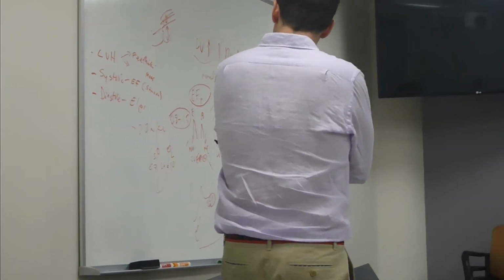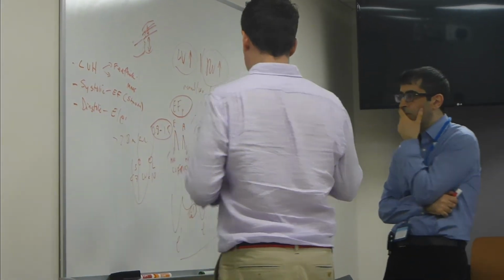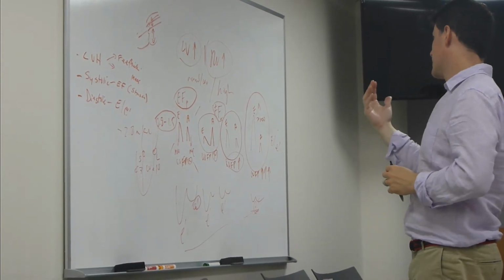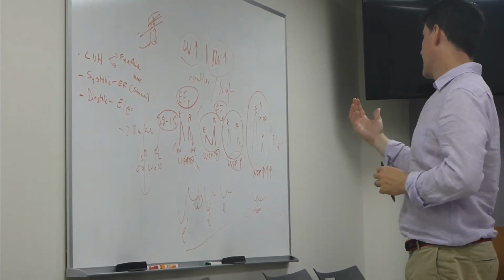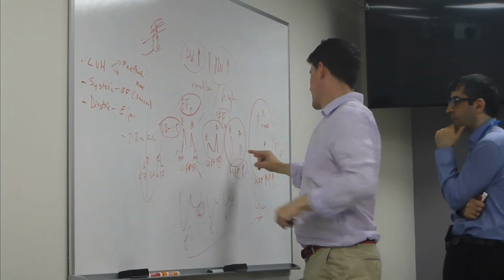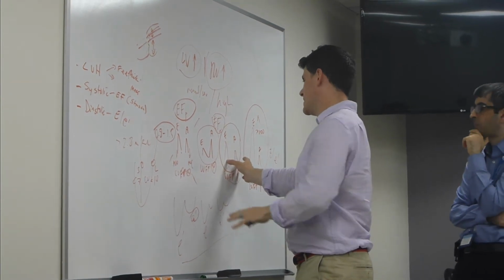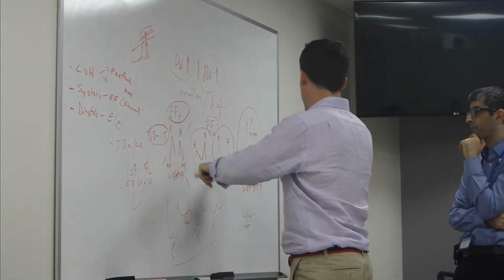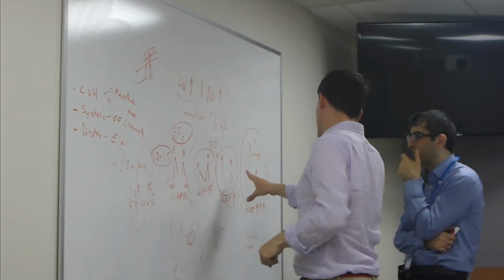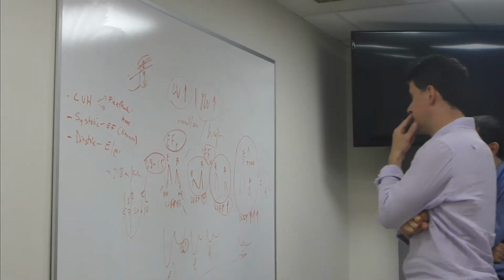Septal, yeah. So would one way to simplify this, and tell me if it's too much of an oversimplification, be: if visually estimating someone's ejection fraction and it's low, and you see this pattern, then you're really looking at this, not this. Yeah, exactly. And if they have preserved EF, then it could be either, and then you really have to look at the tissue Doppler to assess that.